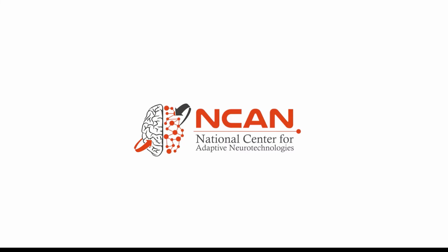You are now prepped with all of the information you need to add the Neuro Omega to your experiment. With a couple of simple steps, the Neuro Omega neuromodulation system can be implemented in any experiment in BCI2000.